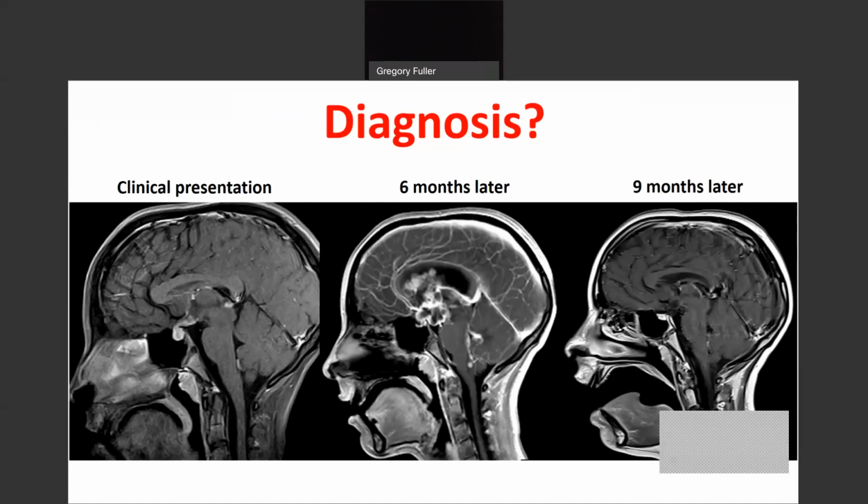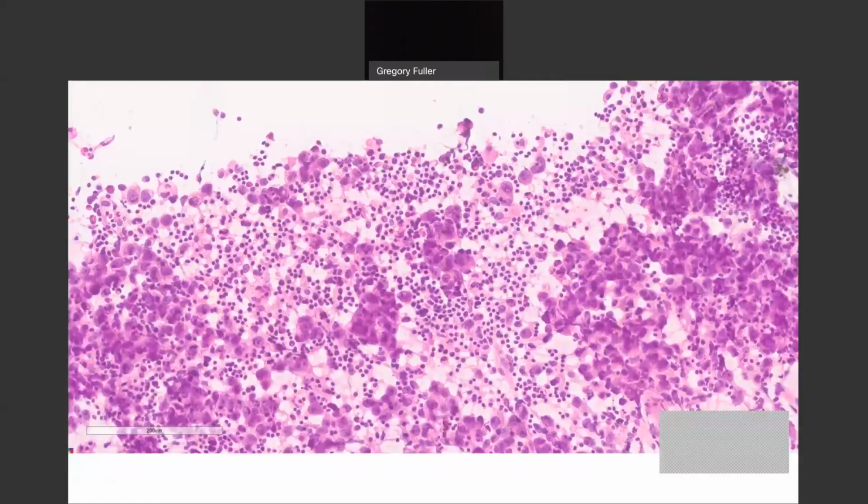All right. I'm going to give some help to the pathologists. I'm going to show you the histology. Here's a smear. I actually don't have the smear for this particular patient. I guarantee you the smears look the same. They all look the same. It's not a difficult diagnosis. So here's the smear. Yes, Dr. Gilbert nailed it. Absolutely. Yes, Dr. Alphatal nailed it. Absolutely. Okay, good job, good job.